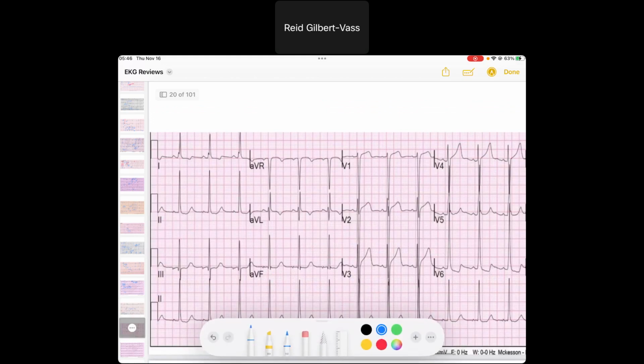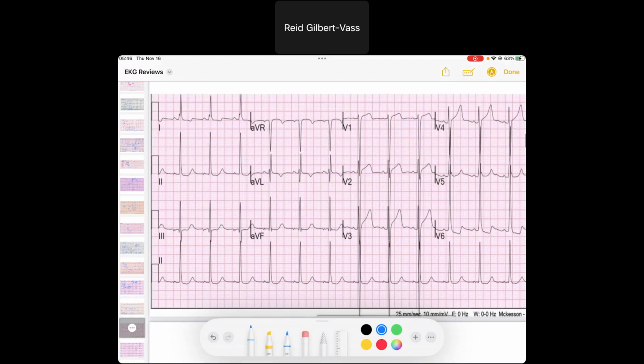Now, we're going to start moving faster. This is going to take me forever. Go.